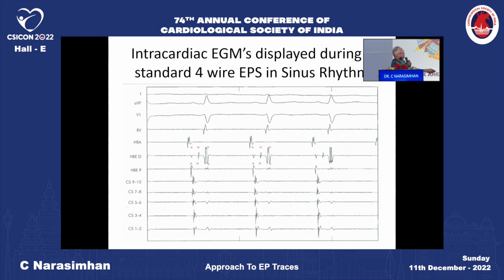local electrogram, and then the low right atrium, followed by an isoelectric interval, which is the amount of activation that happens in the AV node, which doesn't inscribe any electrical deflection, but that is inferred by the AH interval. The AH interval tells you the amount of time it takes to go through the compact AV node, and then generally, because the His bundle is a very rapidly conducting structure, all it takes is less than 10 to 15 milliseconds for the whole His bundle activation to get over.